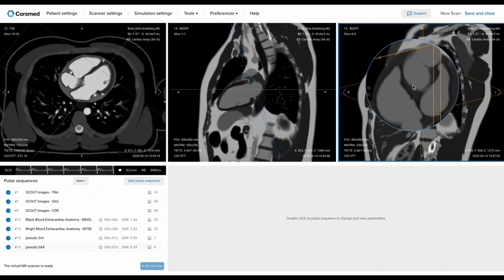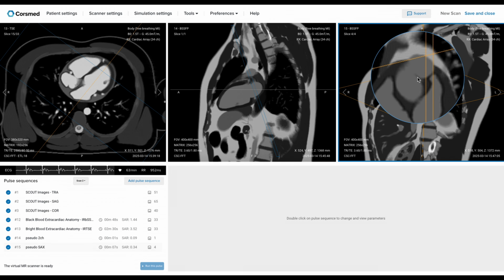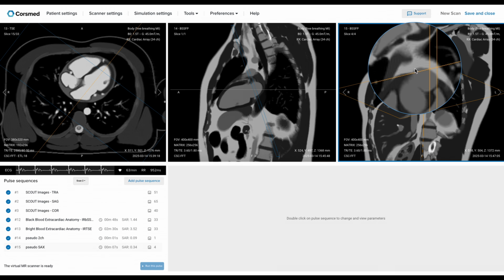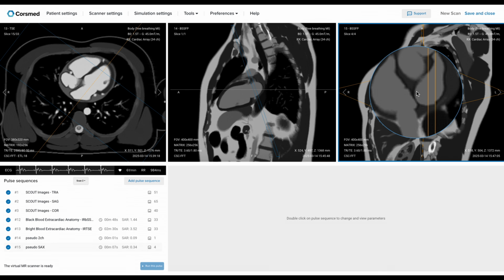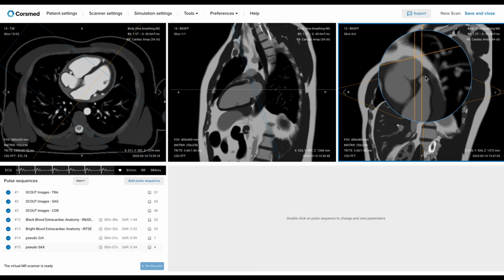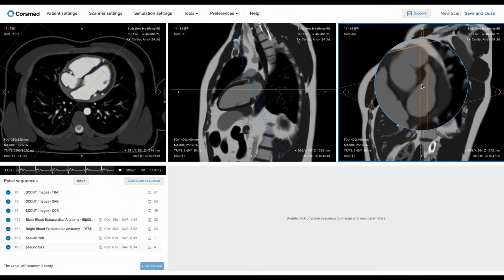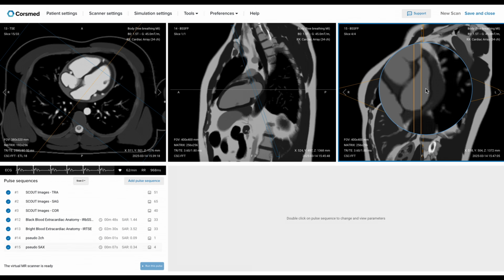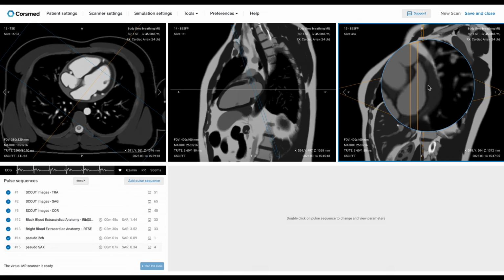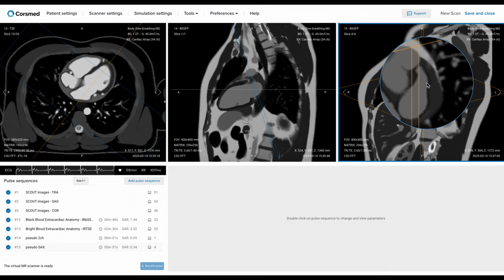This part over here is the aorta. Right next to it, we see the pulmonary artery. Over here is the left atrium, and you can see the left atrial appendage, this small part of the chamber that extends sideways. The left atrial appendage is important in patients with arrhythmia or atrial fibrillation. It's a common site where thrombi, small blood clots, may collect. This can make it especially risky in these patients.